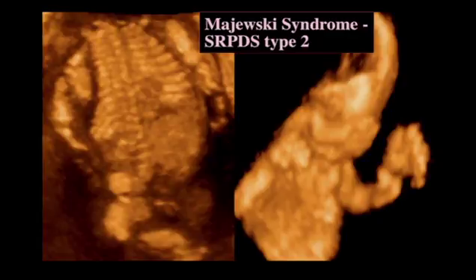Now, this is the short rib polydactyly syndromes. This is the Majewski syndrome type 2. And what distinguishes type 2 from the others is the facial cleft, which is not shown on this view. But what is shown on this view is the extra digit and the short ribs and the very narrow chest, and of course the abnormal long bones, making this a severe skeletal dysplasia.